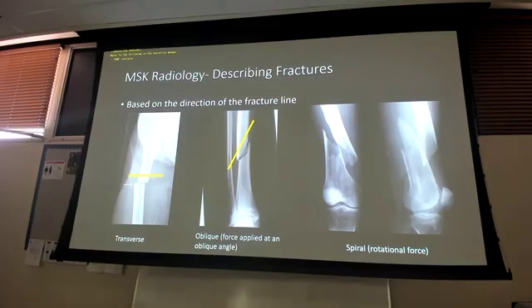So you're right, I said don't get hung up on it if you don't have context clues. But we do, because we have the pelvis and we know where the femur is going. So I know that the femur is coming in here, here's my acetabulum, here's my pubic symphysis coming in over here, so the rest of my pelvis would be over here, and I would draw my other leg here, so now therefore, my left is the patient's right, that's a right femur.